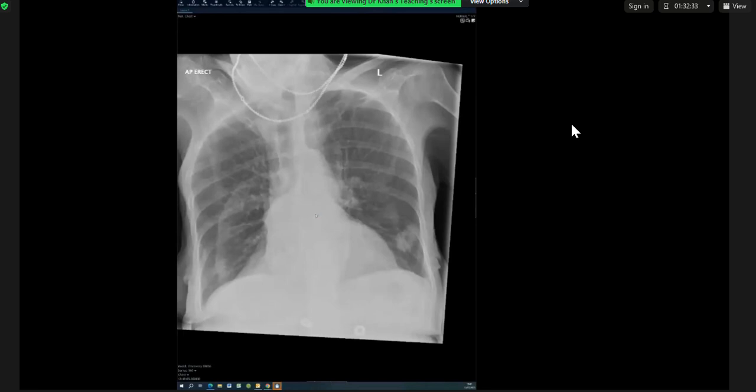And then you pause, and then they say something like fever, then it's infection. Then they say something like smoker, hemoptysis, and you say, given the history, I would be suspicious for malignancy. And if it's something this big, this sinister looking, if it's cancer, it is a very advanced cancer. So you can't just do a CT chest. You want the whole staging.